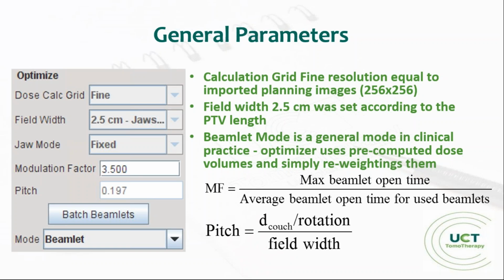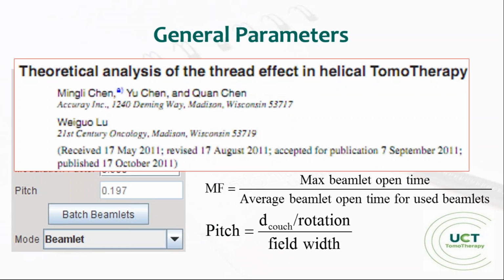So pitch was set according to this article, 0.197.